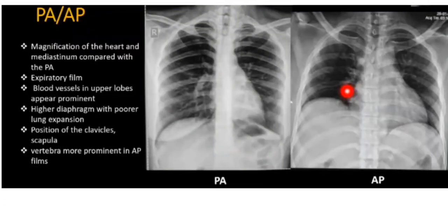Good afternoon, everyone. Today we want to do a little bit of interpretation and clarification on how to interpret X-ray. Before we go further, an X-ray can be done in PA, posterior anterior, or AP, which is anterior posterior. We will see the difference between posterior anterior and anterior posterior. But in the imaging aspect, how can we differentiate this? Is this a PA or is this an AP?